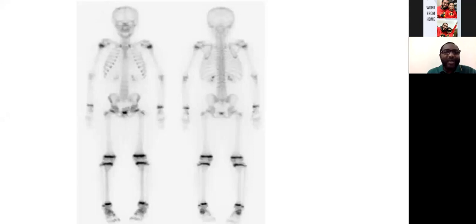So when you look at a bone scan, the first thing you should be able to do is to identify it. Again, we can say that this is a bone scan because predominantly we can see the skeleton. And the next thing is that we can see the kidneys. If you're looking at the kidneys, always look at them posteriorly, because we know the kidneys are retroperitoneal, and therefore they are much closer to the camera head on the posterior projection. So you can see the kidneys better. So this will confidently tell you that this is a bone scan.